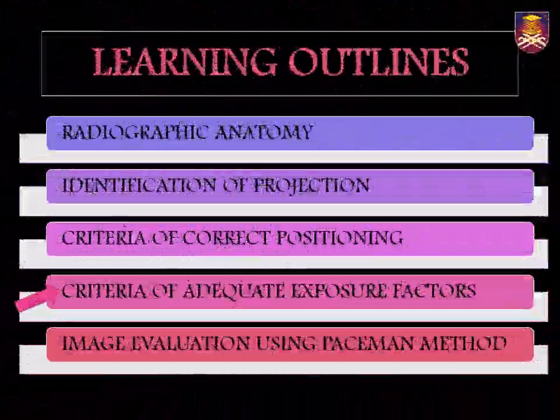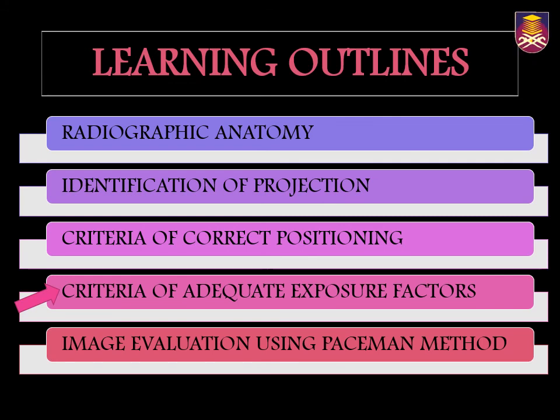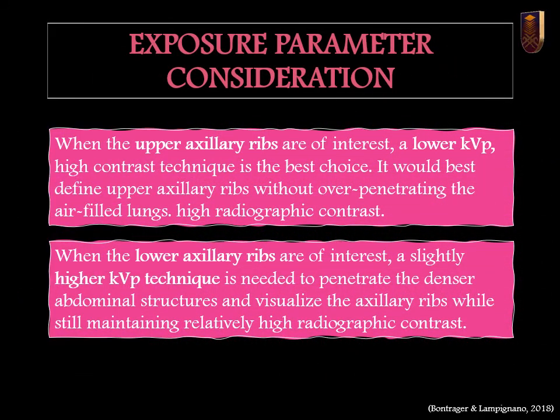Next, let's discuss the criteria to indicate adequate exposure factor. In determining the optimal exposure factor to be given to the patient, the radiographer should take into consideration which part of the ribs is of interest.